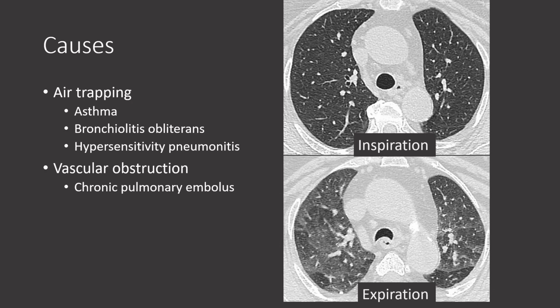This makes sense. As you blow air out, the lung becomes partially atelectatic. However, also note how some areas during expiration remained lucent. These areas represent mosaic perfusion from air trapping. This was brought out during expiratory phase imaging.